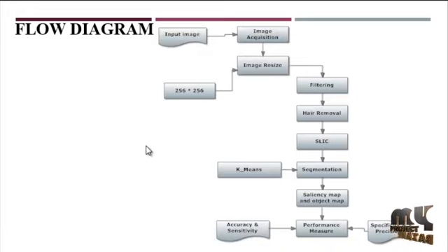The flow diagram represents our flow. The first module is image acquisition. In that module, we get one input image from the dataset. The first stage of any vision system is the image acquisition stage. Image acquisition is the digitalization and storage of an image. After the image has been obtained, various methods of processing can be applied to perform many different vision tasks required. First, we capture the input image from the source file by using the imread function.